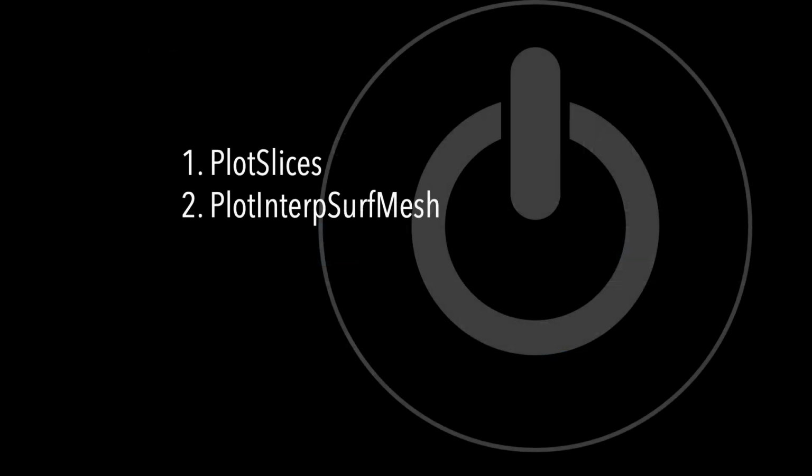In this tutorial, we summarize the plot slices and plot interp surf mesh functions. Use of the Render Tool app is described in a separate tutorial. For brevity, the example shown here will demonstrate the MATLAB version of the functions. The Python implementation is functionally identical.